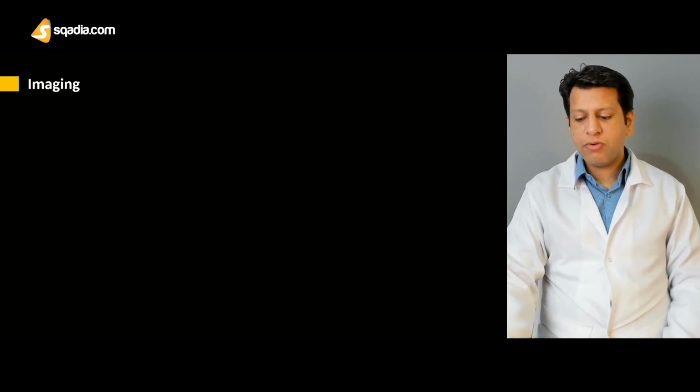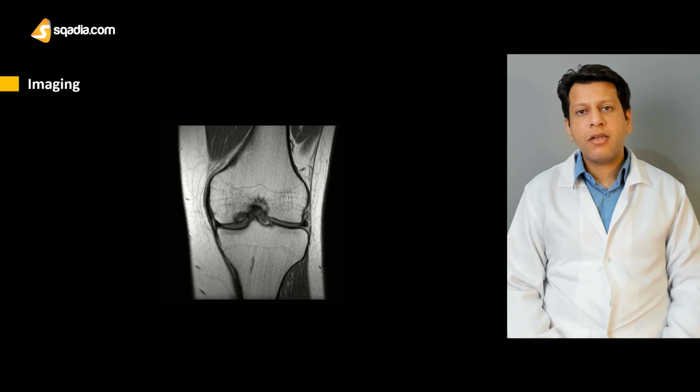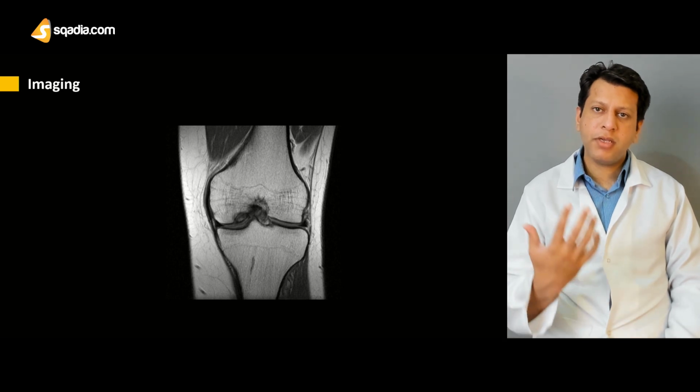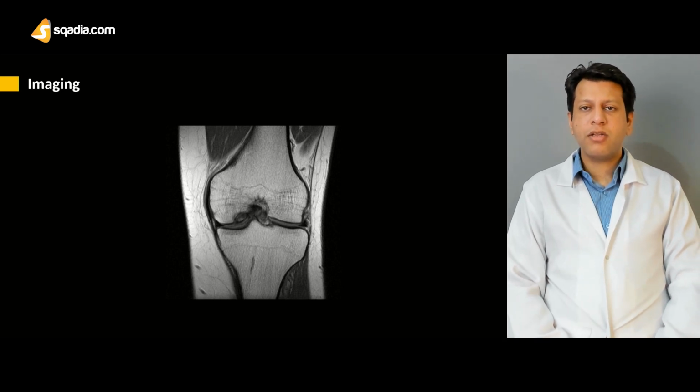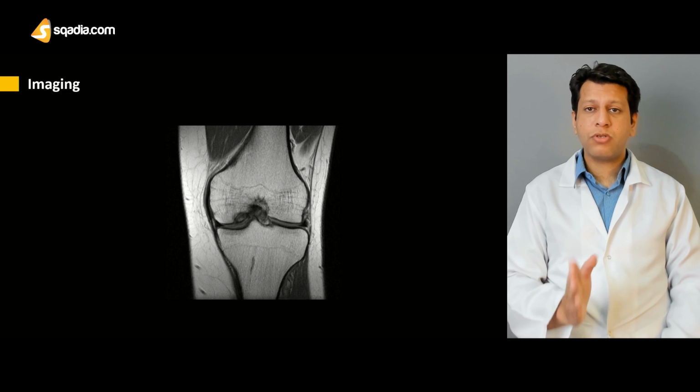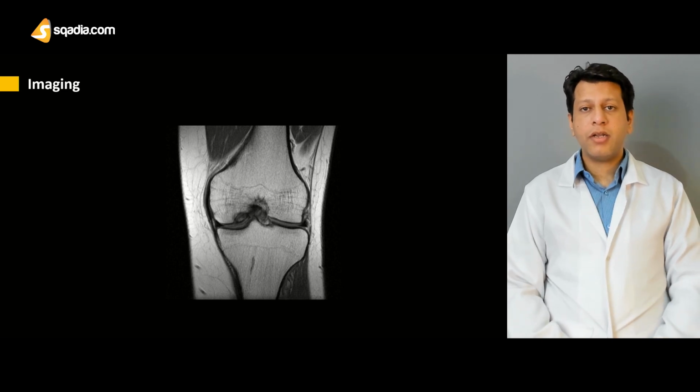Because on the AP view we get to know what exactly the pathology is over there. Is there something wrong with the patella? What is the situation with the fibula, tibia, and both femoral condyles of the femur? As I told you, about 60 to 70% of the time, it's on the posterior lateral aspect of the medial femoral condyle.